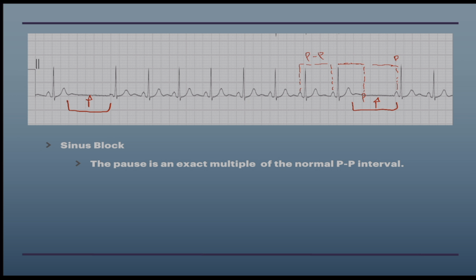So if I take my normal look at a rhythm and ask myself these questions, is it fast or is it slow? Well, it actually looks like it's just a little bit fast. It's hard to tell with the way that we're looking at it here, but 300, 150, 100. So we're at about 75, so it's not fast. It's going to be within normal heartbeat limits. Is it regular? Well, it is regular, but it's what we would call regularly irregular, because we have these couple instances where the intervals drop. So something's going on there. That tells us we're going to come back to that.